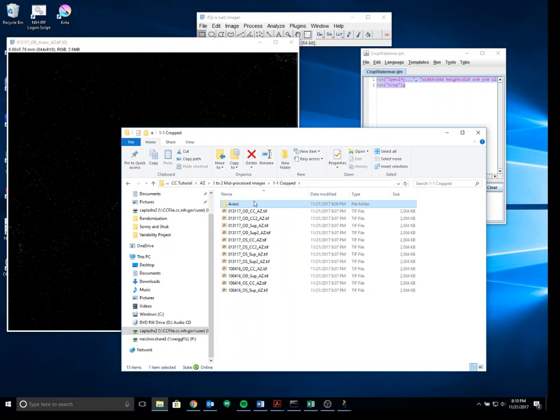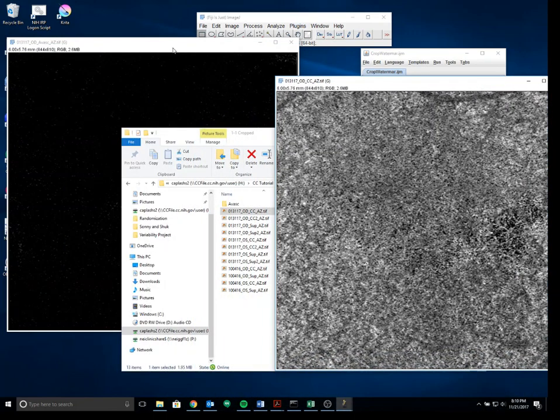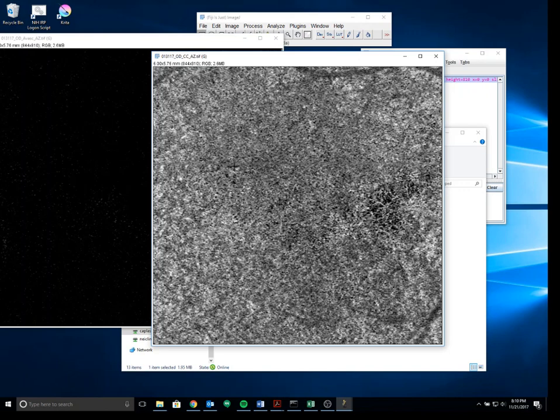So essentially, as I was saying earlier, this algorithm works by looking at the avascular zone, and it's going to take the mean blackness, or how black the pixels are here, and it's going to come up with a value. And what it then does is that it scans through this entire image, and anything that falls into the range of the blackness of the avascular zone will be quantified as black here.